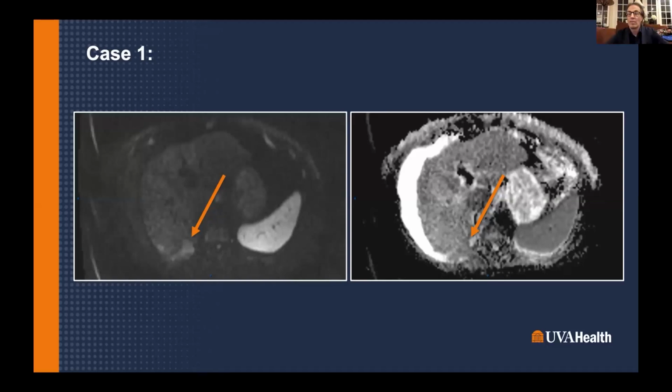Yeah, so in this case, it was the area that was treated, but you point out that this is information that will not be available, and certainly not routinely, to everyone everywhere who's interpreting this, which is intra-procedural images that provide some cross-sectional mapping of where things were delivered. And one of the take-homes for the interventionalist may be the importance of getting that, even though we may have pre-mapped it beforehand, for this very reason and for follow-up imaging.